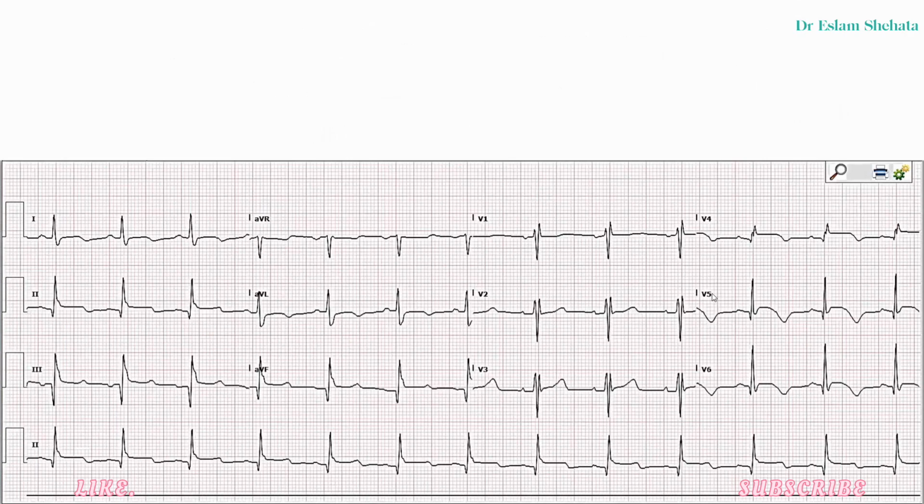Alright, so here's another example. Again, I'll get you to pause it, and then I'll start talking through it.